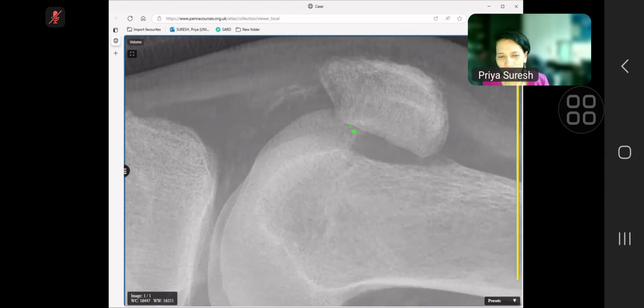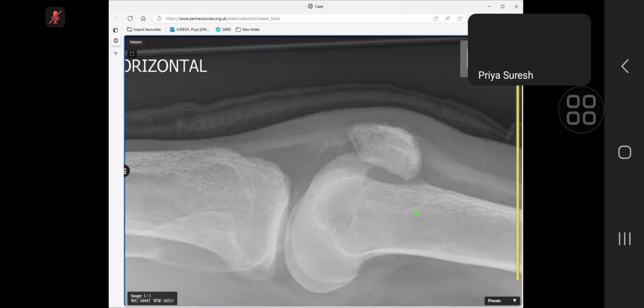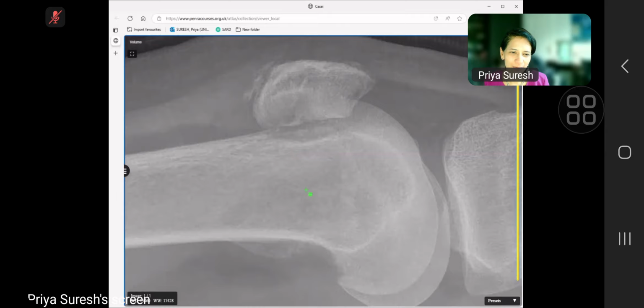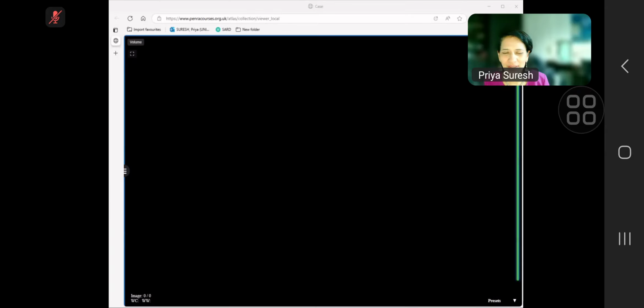You're right, it's not like a subchondral cyst that you have there, and you're looking at it tangentially. Okay, so it's a brown tumor in the distal femur, and the same here. Look. Okay, and on this you can see the thing.